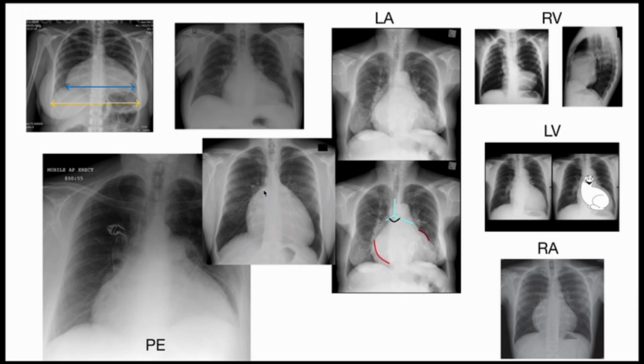heart chamber. If it is a specific heart chamber, then we look for features, for example, specifically for the left atrium, because it is posterior in a chest radiograph, it tends to splay the carina angle. So we get splaying of the carina angle and that double shadow appearance, again shown here. So that is seen in the left atrium.